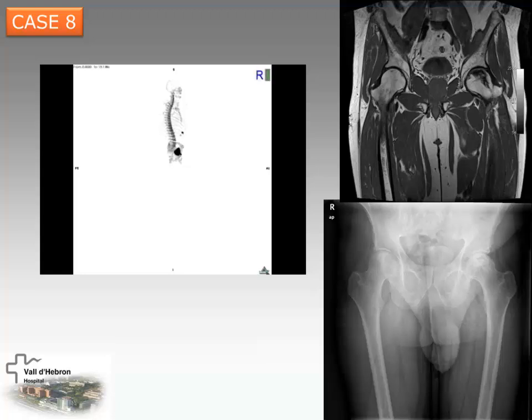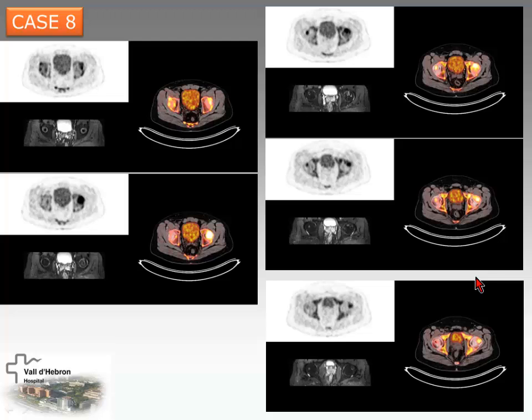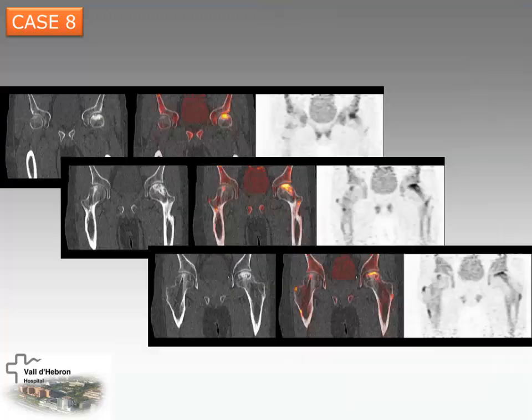Okay. Another case. What do you see? What's that? Look, it's like a tunnel here and here.